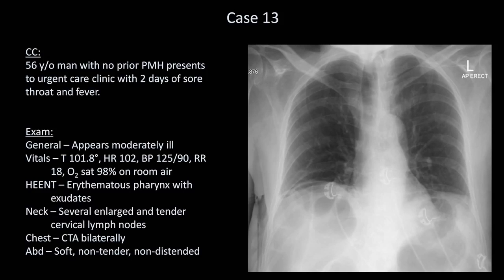What is interesting, though, is this right here. It kind of looks like the patient may have free air under the diaphragm, that is, pneumoperitoneum, which is often indicative of a surgical emergency. The first clue that this is not pneumoperitoneum has nothing to do with the X-ray, but rather the clinical scenario. The patient is not presenting with any abdominal complaints.